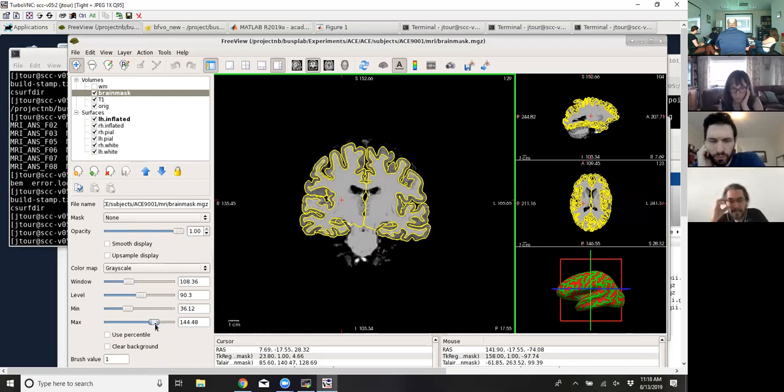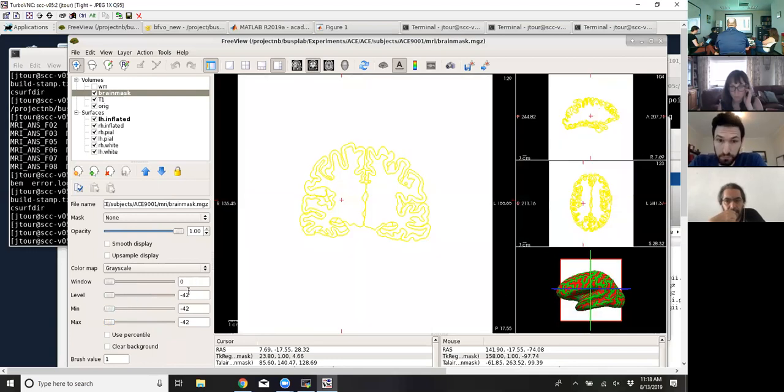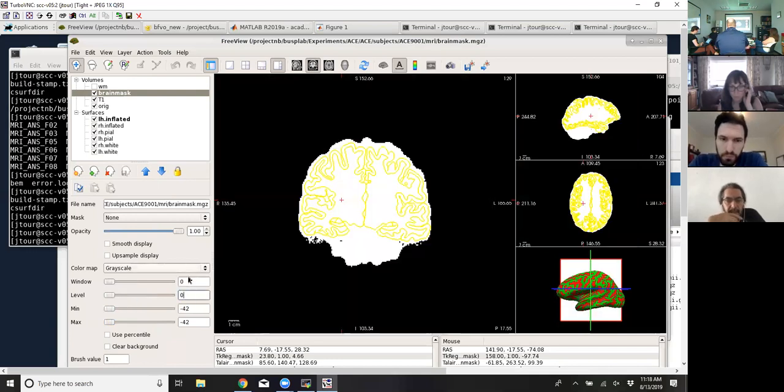So we saw an instance yesterday. For whatever reason, occasionally when you load these up, I think it's following a crash, where it just crashed without you closing it, it seems like there's some temp file that lists your preferences for this, and one of these will load up with everything at 0.